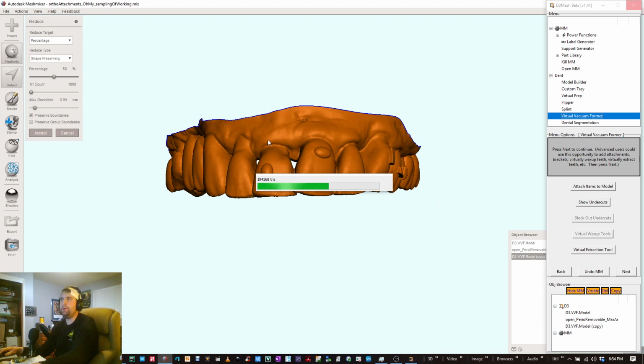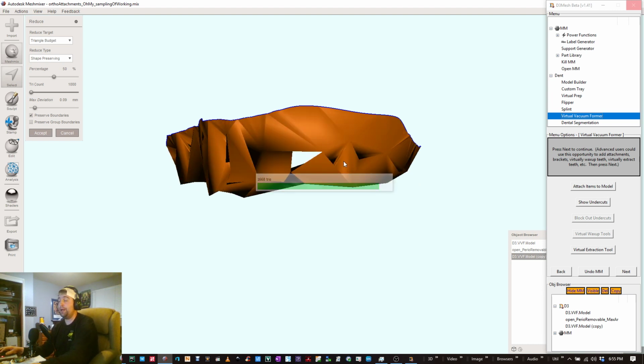I don't think I'm going to go through that part because we've already done it, and this video is mainly just to show you that we have attachments, and they're working pretty good, and there are a lot of really cool things you can do with them, as far as changing the geometry and manipulating them and optimizing them, whatever that means. I see that term thrown around.